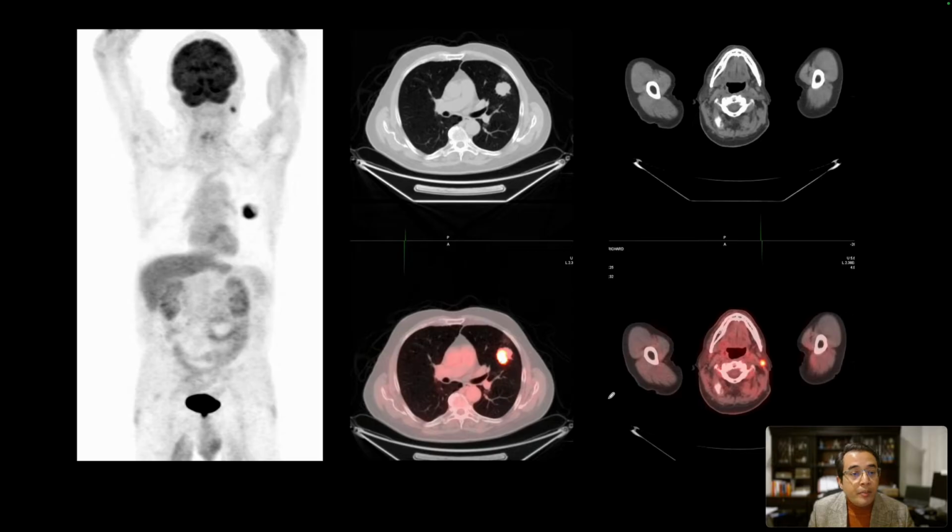Here's our next patient. On their rotating image, we find that there is a lung nodule that shows focal hypermetabolism, which is seen right here and here, which was biopsied and shown to be lung cancer. Incidentally, we saw uptake in the left side of the neck. This was a soft tissue density in their left parotid, and these are common findings on FDG PET-CT studies. Most of the times when we have biopsied them, they turn out to be a benign tumor of the parotid, such as a Warthin's tumor. And that's what happened in this patient. They had a benign parotid tumor.